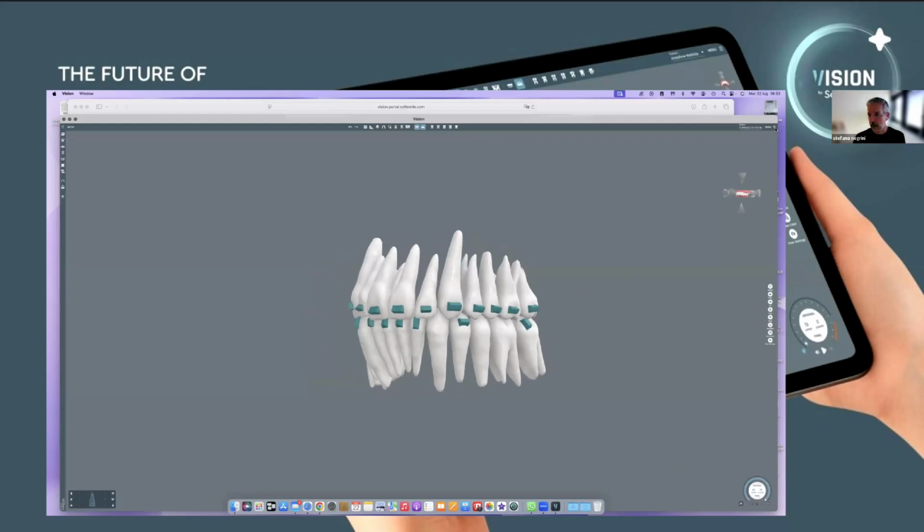Finally, I save everything and I send it to the doctor for checking. And if the doctor likes it, I go to the post processing, and if not, the doctor tells me about some different type of changes. That's it.